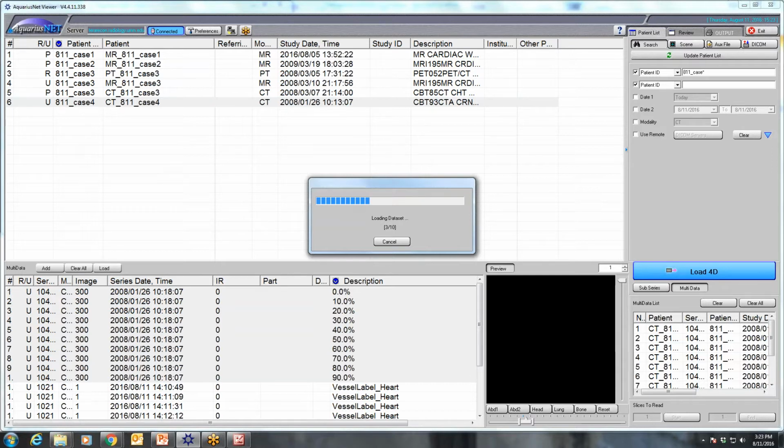And the last one, which will take way too long to load, is an old study, not a good study, but an old study showing an impressive atherosclerotic aneurysm of the RCA. That's about a 7 or 8 centimeter aneurysm that the patient underwent surgery for.